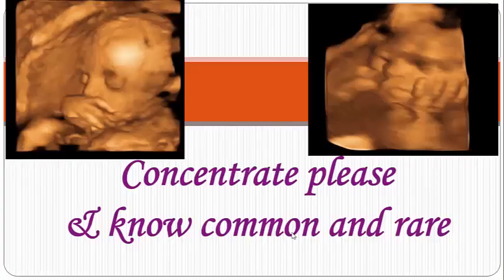Every time we will show some pelvic interesting cases. So please concentrate to know what is the common in this scenario and what is the rare, and try to find differential diagnosis.